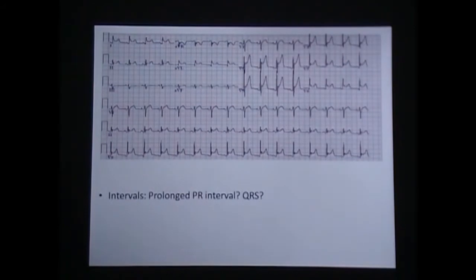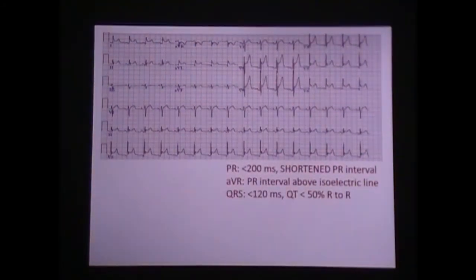Okay. PR interval, QRS. That looks all within the specs of normal. I agree with that. So the one thing is there's a shortened PR. For a shortened PR interval, it's slightly shortened. To be shortened, it'd be less than 0.12. If you look there, it's pretty close to banging onto the QRS. Okay.